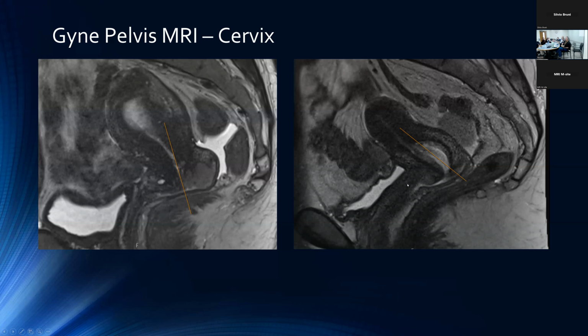On the right, the cervix is slightly curved, more uniformly thickened along its entire length due to presumed cervical hyperplasia in this case, and the line of that long axis best approximates, again, the long axis of that thickened endocervical lining.